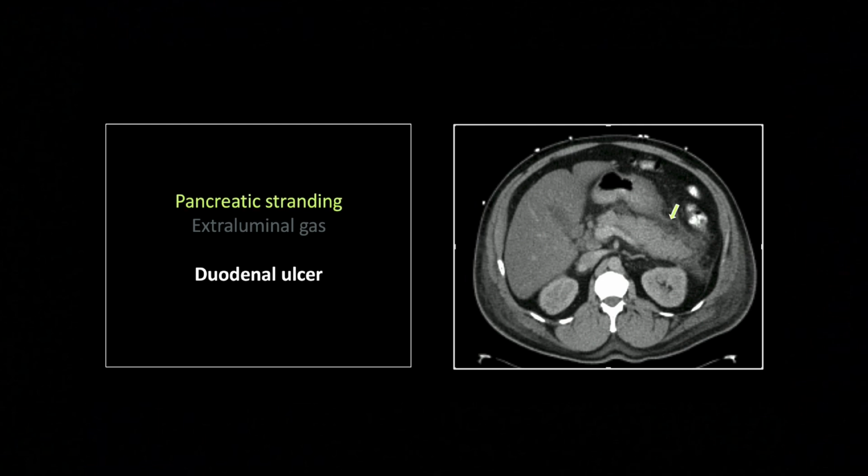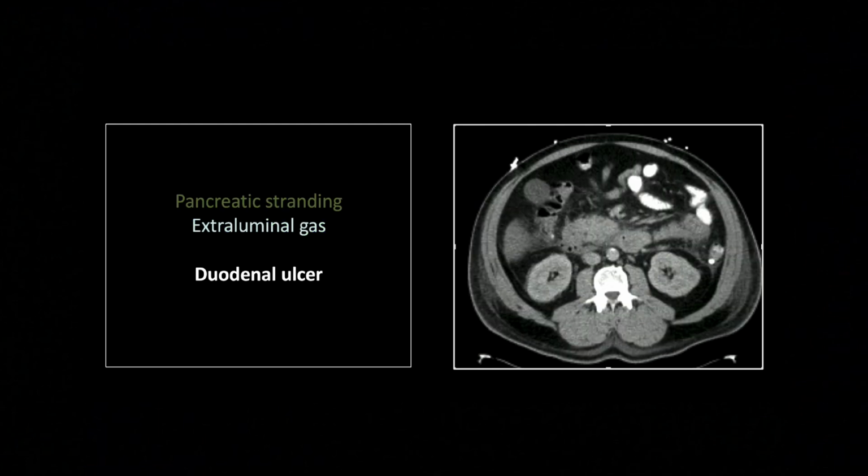Pancreatitis can be very subtle. And this one I would call moderate in degree, maybe even moderate to severe, because oftentimes you can just barely detect the wisps of peripancreatic fluid. This one is due to a perforated duodenal ulcer.